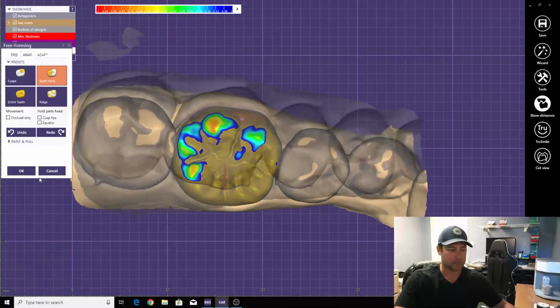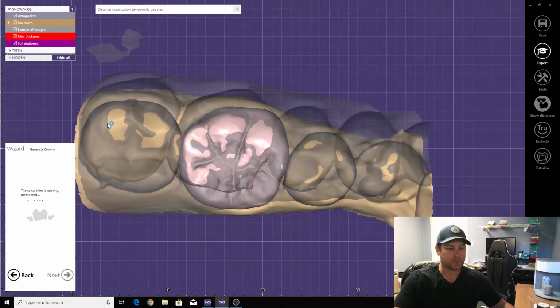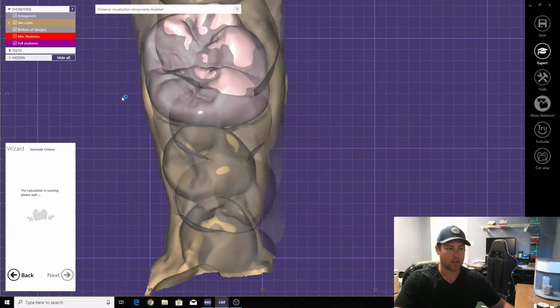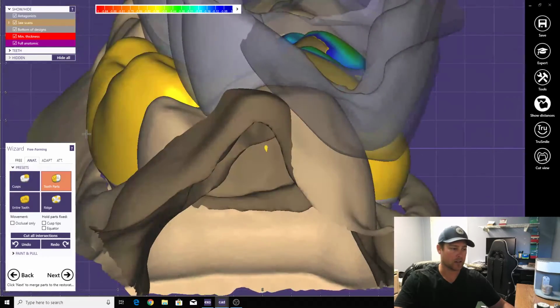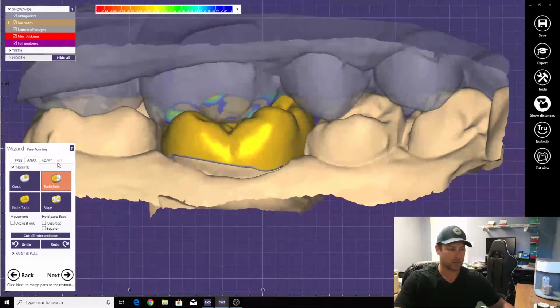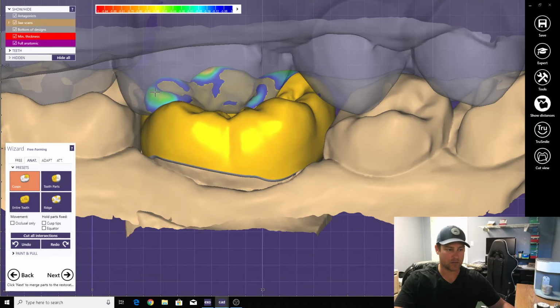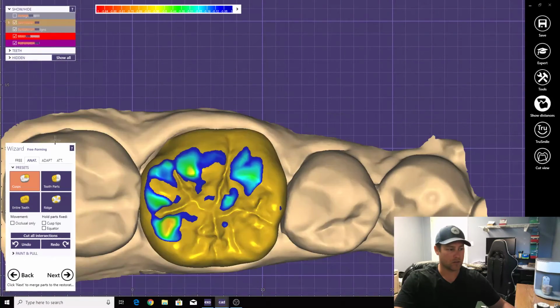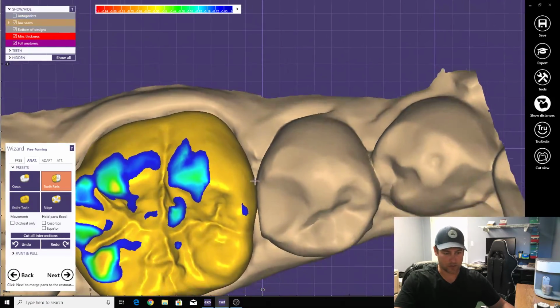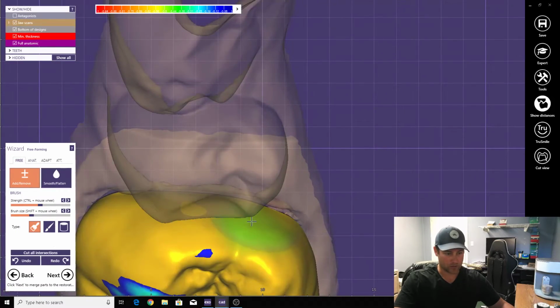Okay, we'll go ahead and adapt. One spot over there, so that's why it's all fat. Alright, and I'll fix this up over here. Everyone designs their own way. I don't really have any particular way I do it.